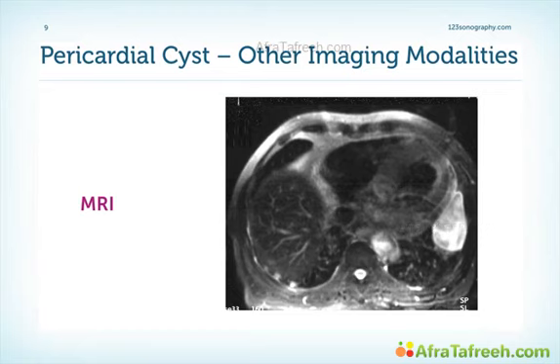Here is an MRI image which shows you such a large cyst. As a matter of fact, this is the same cyst we saw previously in the chest X-ray, located here in proximity to the left ventricle.